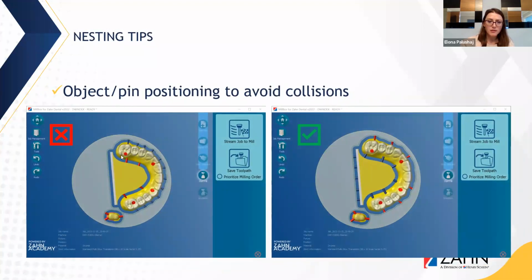Object pins. Very often I see multiple pins for bridges. It's really not necessary. Usually it's one every other, but sometimes even less is okay. Very important that the screws in between the stabilizer and the bridge are solid blue, not red. You don't want those cut.